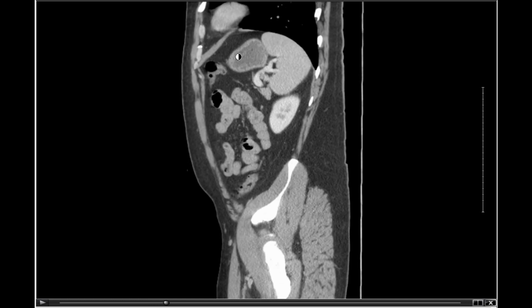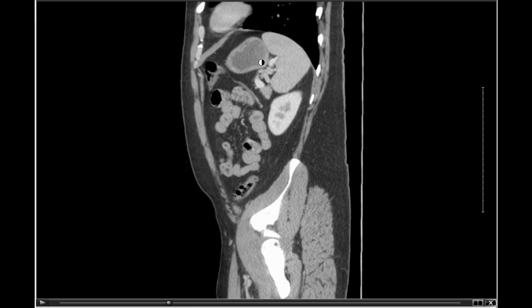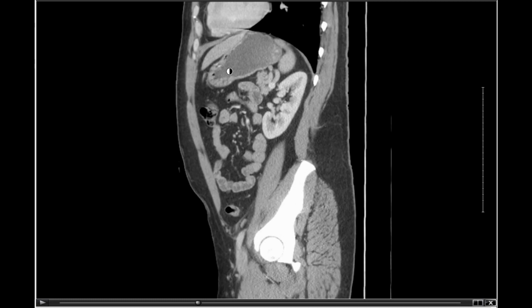And here I've got two new organs we haven't seen yet, stomach and kidney. So let's take a moment and follow the stomach further to the right. So we've got it right here. It's got some fluid in it, which is interesting. And as we go a little further in, there's some rugae. Picking up a little bit of gas bubbles trapped in there, which is not too shocking.